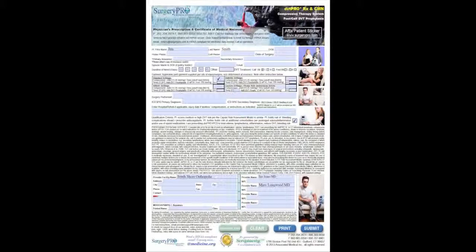Now that's saved, and I haven't overwritten my original file that had my pre-completed practice information. So now I've got a PDF that is pre-completed, my script, ideally digitally signed, that can be attached to my EMR for this patient, or printed out, of course, and added to the chart. And the other thing is that if I don't want to do a digital signature, I could just pre-complete the script, print it out, sign it, have my physician sign it, etc., and fax it in or scan it and remit electronically. So some nice functionality there.